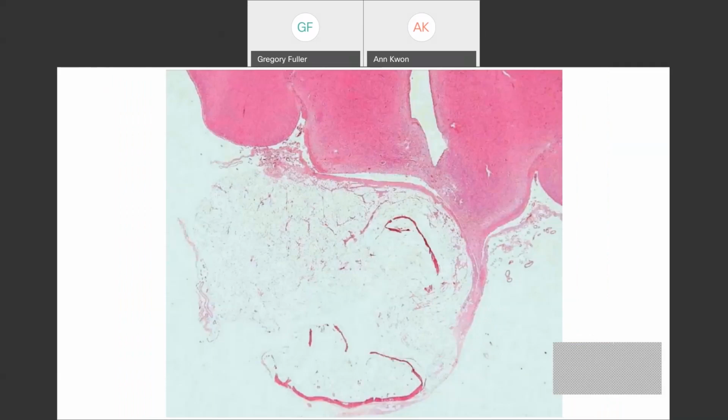And here is the histologic cross section, and I'm just identifying with the blue arrows: this is bone. This one almost had a complete or semi-complete rim of bone on the imaging. Isn't that nice? That's osteolipoma, right? I actually have a glass H&E slide that I use as an unknown. I don't give the fellows any information, just look at it and generate a differential diagnosis. What do they see? They see maybe a little bit of brain tissue, they see fat, and they see bone.